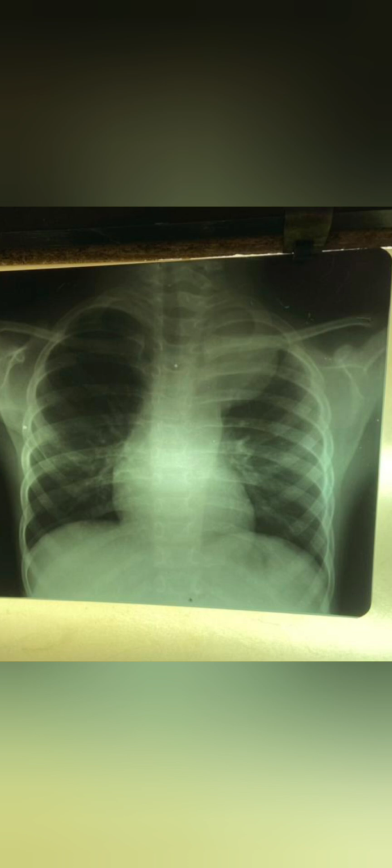Again, chest x-ray, PA view and all, that you have to mention. Same thing. Then the heart borders or aortic knuckle, whatever you can mention. Then normal findings, whatever you can mention. Then the right lung seems to be clear.